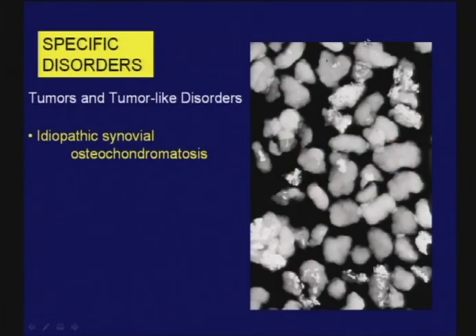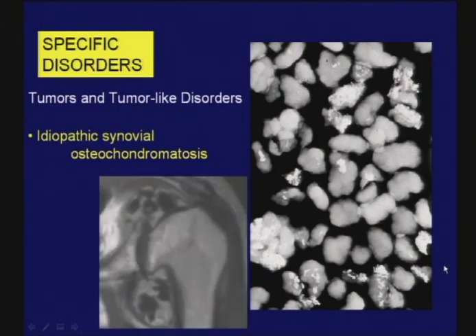When you radiograph the nodules, you can see variability in the degree of calcification. Some are heavily calcified, some almost no calcification. So what happens is the MR imaging features vary. In this old case, with not a great image, you can see heavily calcified nodules within the glenohumeral joint.